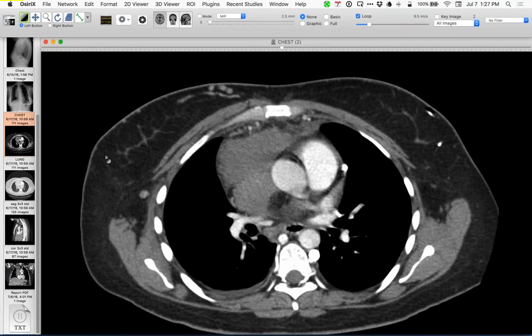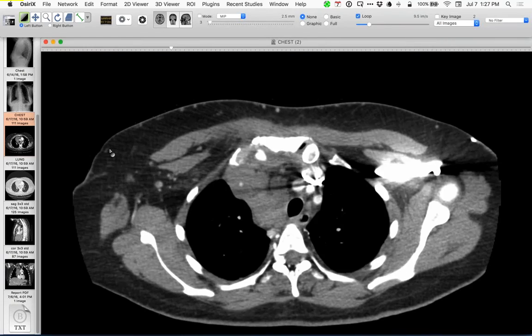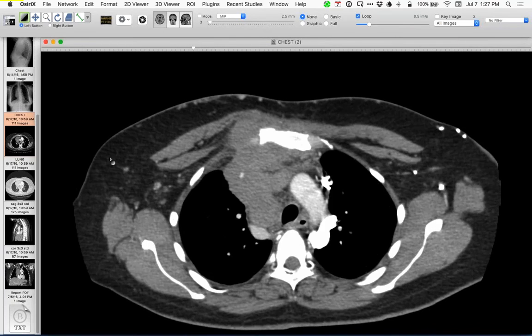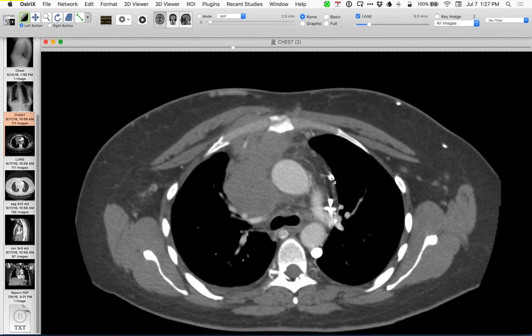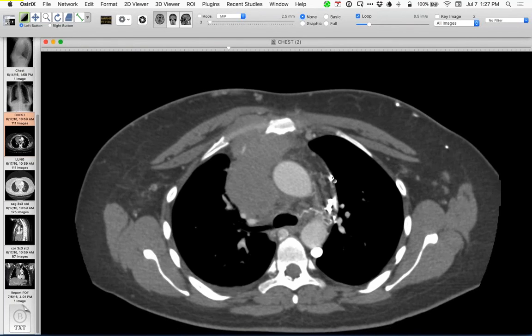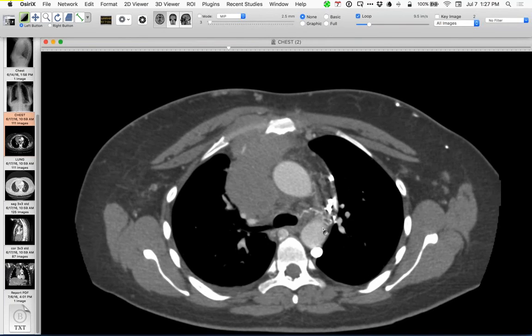Howard, the other point that this helps make in relation to the previous case with the thymoma is if you follow this pericardiophrenic vein up to the level where that previous person had the thymoma, you can see exactly where the phrenic nerve is, because it's along with that vein that's lit up here. The phrenic nerve travels with the pericardiophrenic artery and vein, in close proximity to this. So that corresponds exactly to where you showed the tumor before that they resected in the previous case. Yeah, that's why the phrenic nerve was at risk.